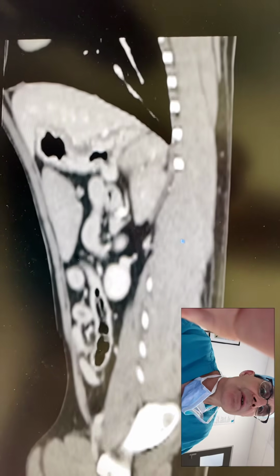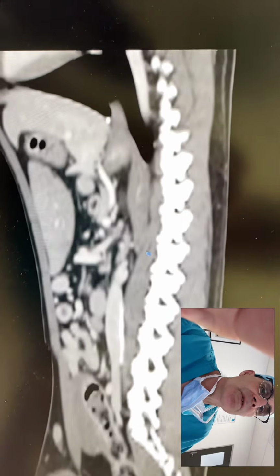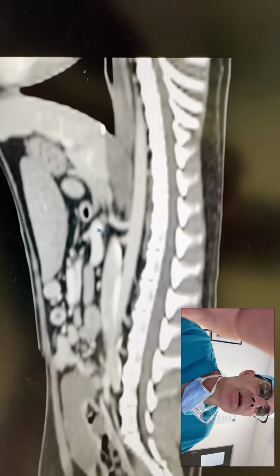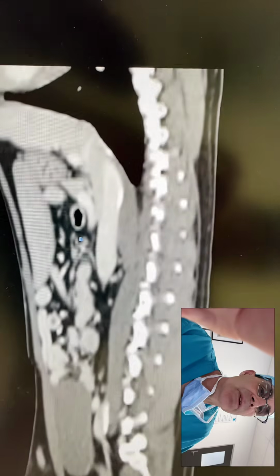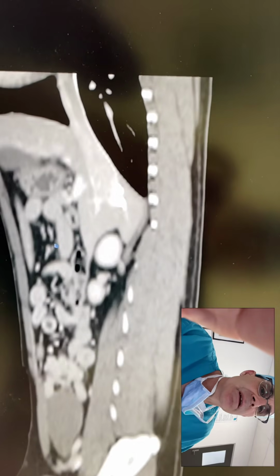And so we don't see any evidence that there's any contact between the portal vein and the vena cava. There is the vena cava there, so that's that big structure right there, and that's the portal vein right there, and at no point do those two structures meet. And so that tells us again that we do not have a portosystemic shunt in this patient.